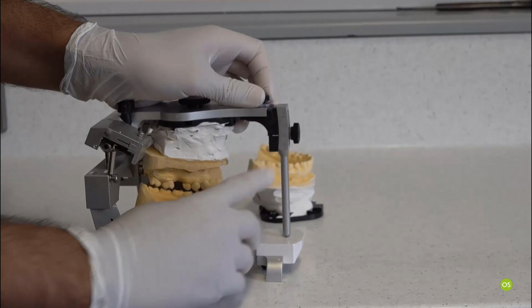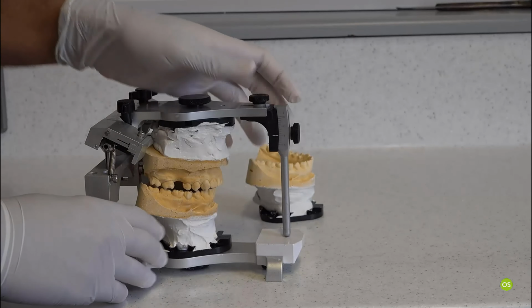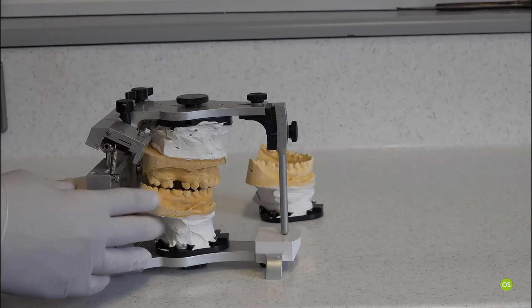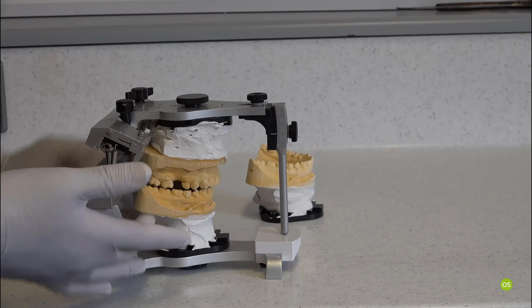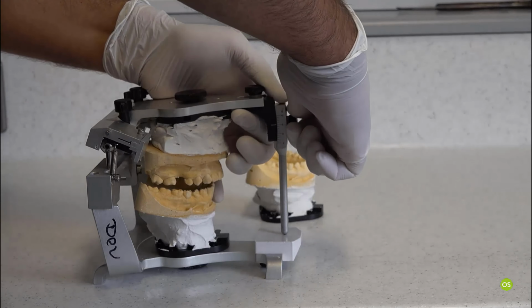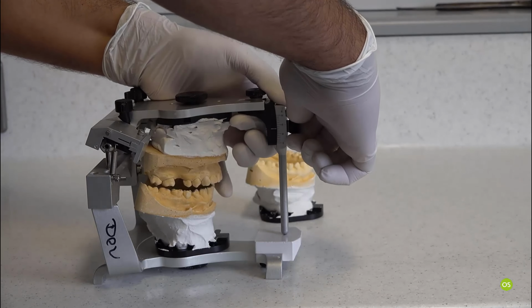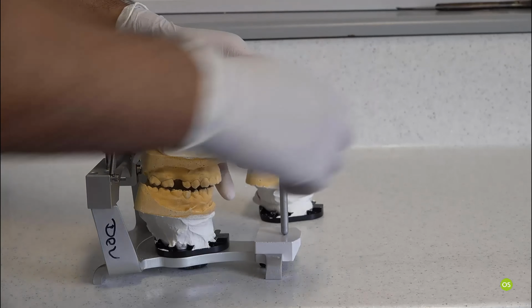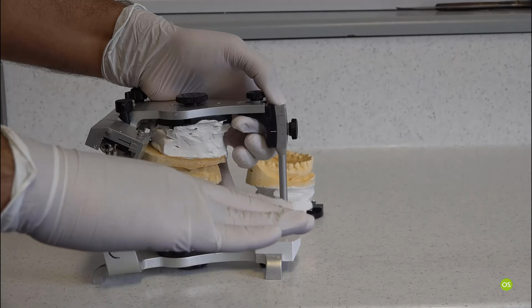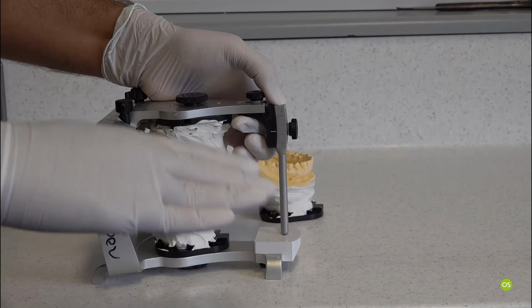So when it's 0, this is the ideal CR, and this would be more or less replicated in the patient's mouth at this level. However, if I'm moving the pin up or model up or down, then it is not an exact replication because the jaw doesn't move up and down like this. It sometimes goes sideways, so it may not replicate the same.